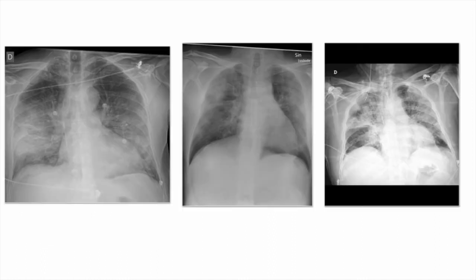So this is a sample of the chest X-ray. You can see this is a bilateral opacity, like a bilateral pneumonia. It's the most frequent radiological sign in case of COVID in the chest X-ray. It's very important for you to know that. When you see these well-visible opacities in both lungs, you have to suspect immediately, oh, this is COVID pneumonia. Always keep that in your mind.